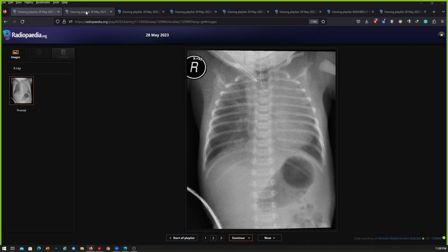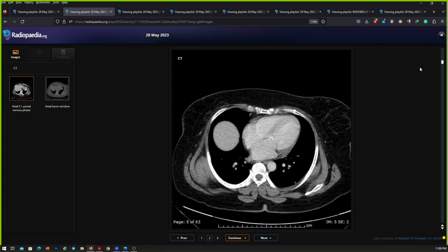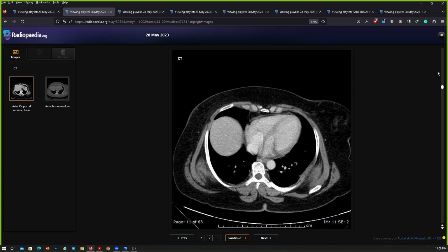Okay. So we move on to the next case. You have the control. You can scroll. The history has not been given, and you can describe your findings. All right. So I am presented with the. Let me just check the scrolling. Just click once and then use your scroll if you have a scrolling mouse. Yeah, you can do that as well.